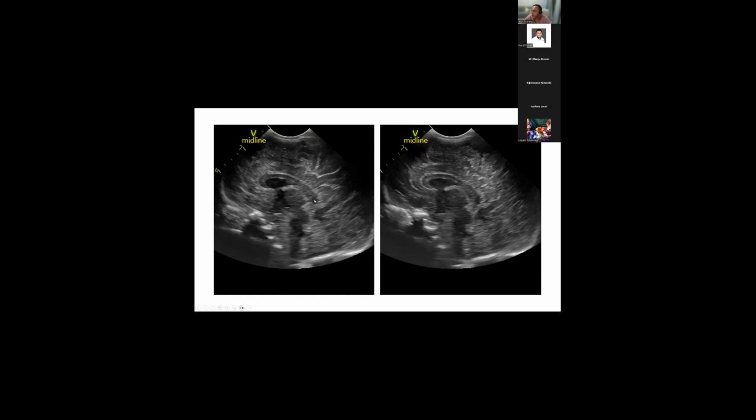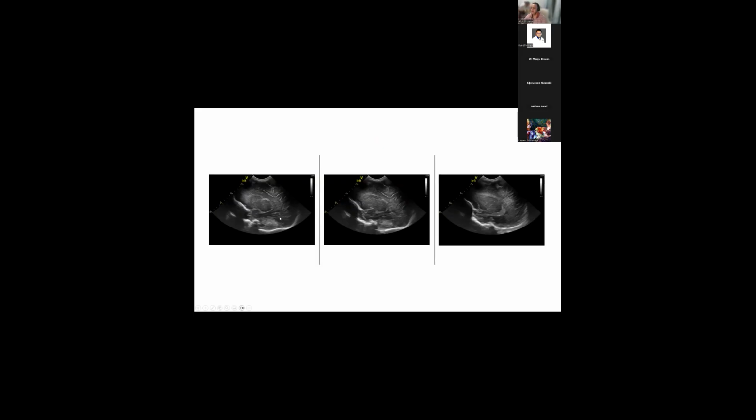But what I've classically got is the corpus callosum right up till the anterior commissure. This is the ventricular communication. This is basically the fourth ventricle. This is the ventricle communicating, the third ventricle. This is vermis, and this is cerebellum. So it's a pretty okay view.